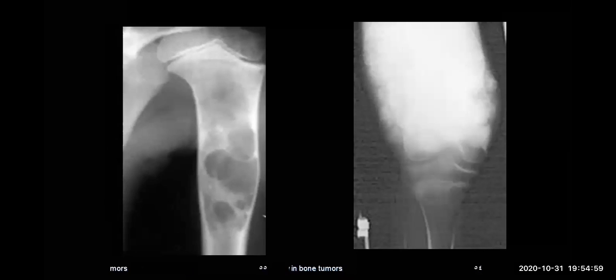So, examples. I wish there was interaction so we could hear you, but this is popcorn calcification, popcorn. So this is chondroid. This is chondroid. This is velvety or fluffy or cottonoid, which is an osteoid lesion. Okay? Osteoid lesion. Most likely this is osteosarcoma. And this is the soap bubble or ground glass appearance, which is a fibrous lesion.